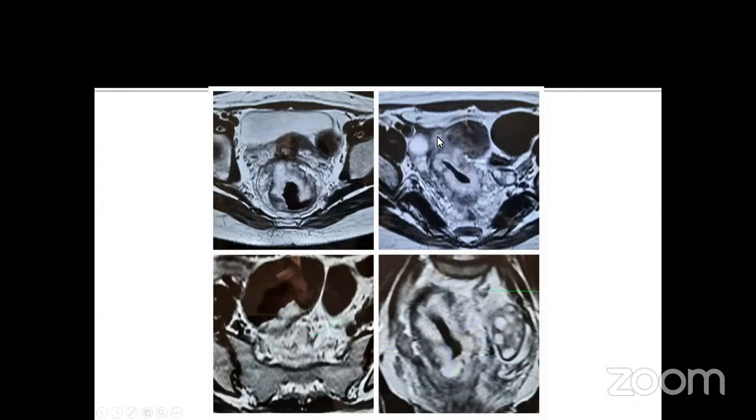If you look carefully, the bulky tumor has gone beyond the mesorectum. There is loss of fat plane with the uterine fundus. It has actually invaded the uterine fundus. So this is an example of a T4B tumor. And if you look carefully here, the vessel within the MRF is dilated and tortuous. So this is EMVI, extramural venous invasion. So this is a T4B tumor. This is the way we interpret MR images.